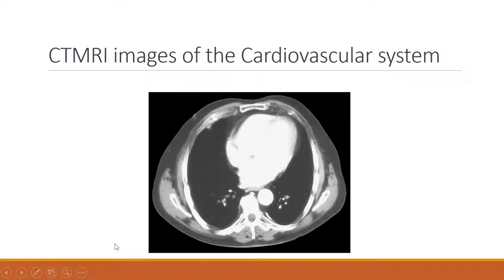All right, so now we're going to look at blood vessels, and we'll do a little bit of heart features as well by looking at cross-section views, specifically computerized tomography, MRI images. This is going to be a little challenging for you at first because you're going to have to train your brain to think in terms of cross-sections, whereas the viewpoint we've been using primarily previously in this unit are frontal views, where you're looking at an anterior view of the structures, but now you're going to be looking at a cross-section. So let's get you oriented first of all.